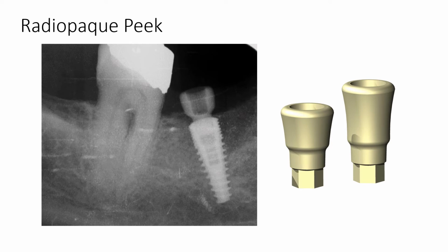And again, this allows us to modify these abutments in more advanced techniques where we're trying to grow or expand our tissues. But on a day-to-day use, the main advantage of these kinds of components is that if they hide the occlusion or prevent a prosthesis such as a denture from being fitted, it's a very easy matter to drill these components down and adapt them so that a denture can fit over the top.